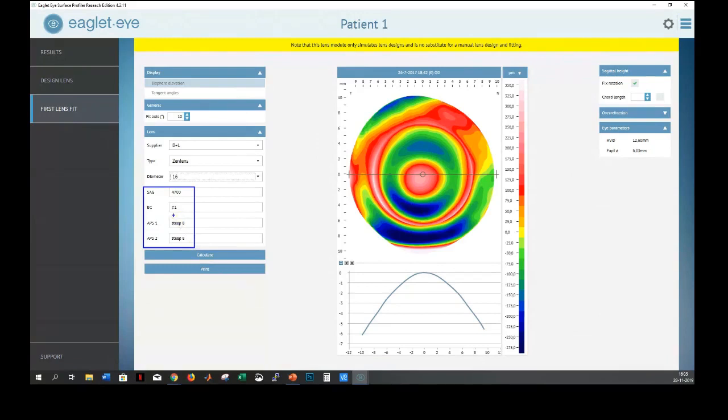The base curve is predicted as well, and you see that in this example, this is more or less spheric. But the interesting thing, this is a very steep eye. So with the normal diagnostic lens, you may see excessive clearance of the landing zone of this lens. So it is predicting go for both meridians 8 steps steeper.